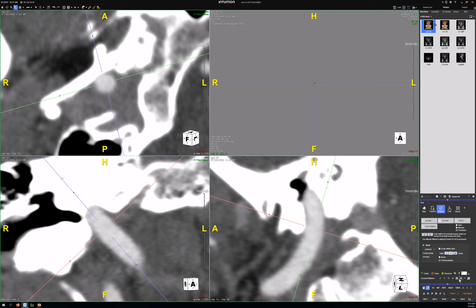Click on your little green overlay, that little green circle down there. So you've segmented, I believe accurately, just voxels that are in the artery. So imagine this distance here. You're centered in the middle.